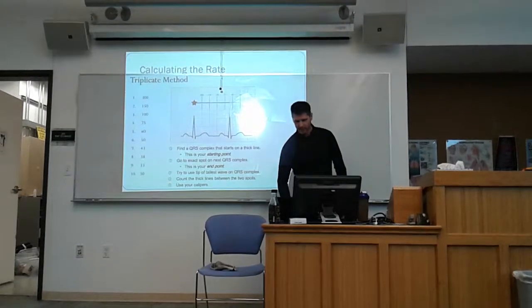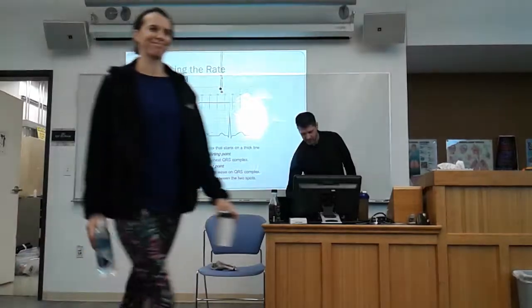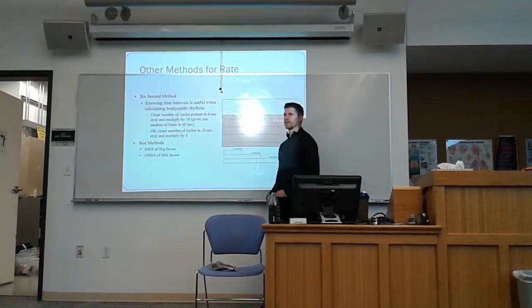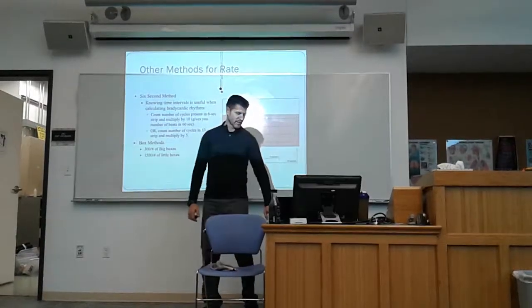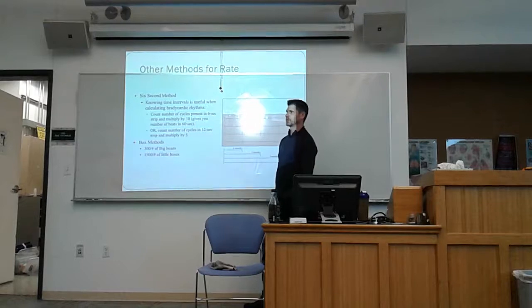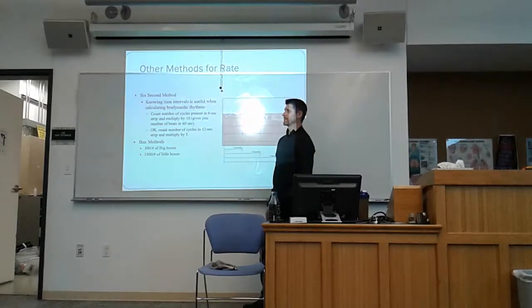Okay. So we established rhythm, we established the rate. All right, what do we look at after we look at rate? P waves. What comes after? All right, so now we're looking at the cardiac cycle itself. This is going to eventually answer Annalise's question that I said you're going to know by the end of today. This is the start of that.